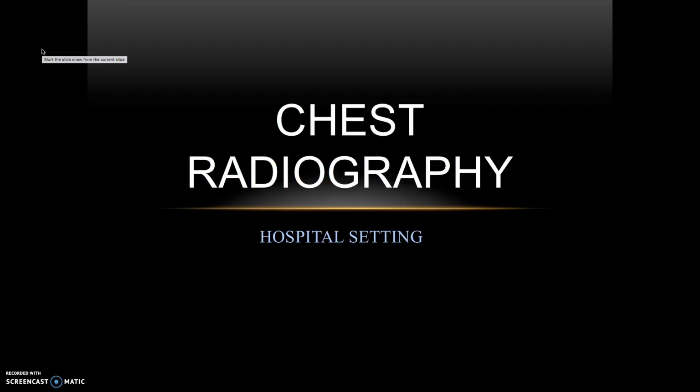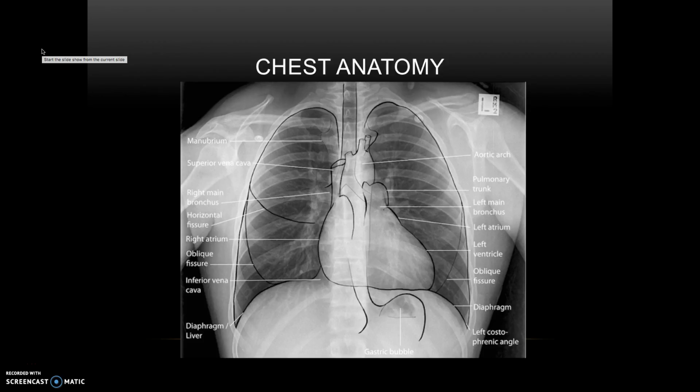Hello, this is a lecture over chest radiography. Towards the end, we're going to be seeing chest radiography applied to the hospital setting. This is a chest x-ray. This image is outlined so we can see the relationship of certain anatomy in the chest.